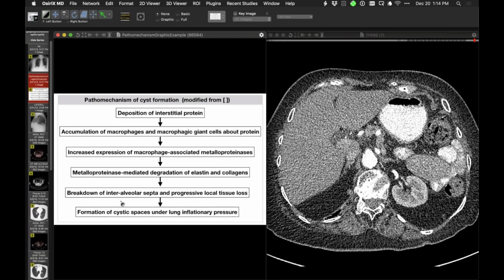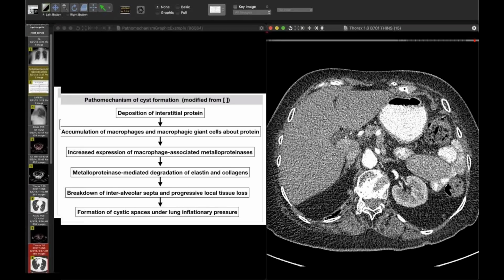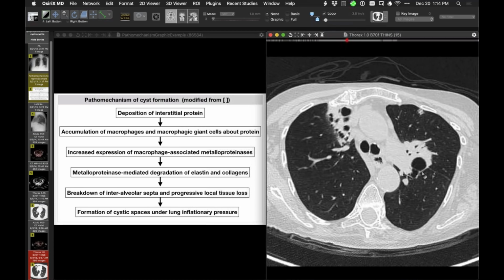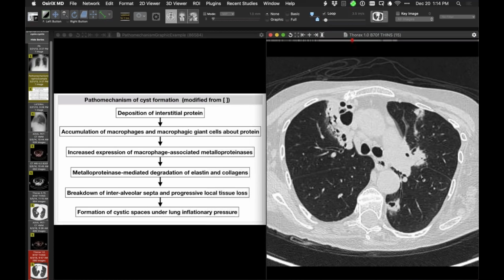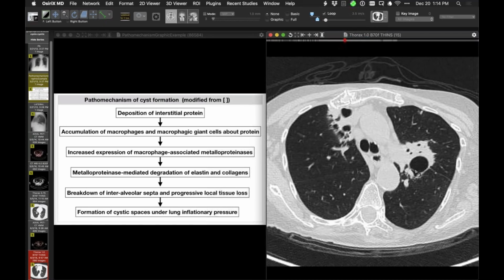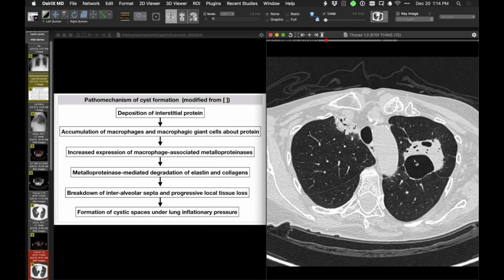And I'm really impressed by how much cystic change as well as bronchiectasis has developed within the upper lobe lesions. This is probably one of the nicest examples I've seen of that phenomenon, where one can easily explain this knowing the pathology. What you see there.